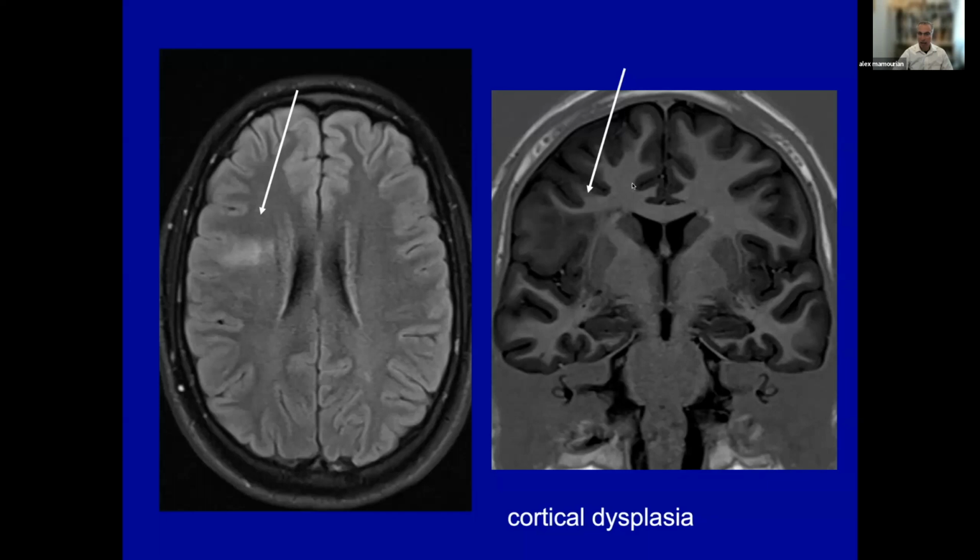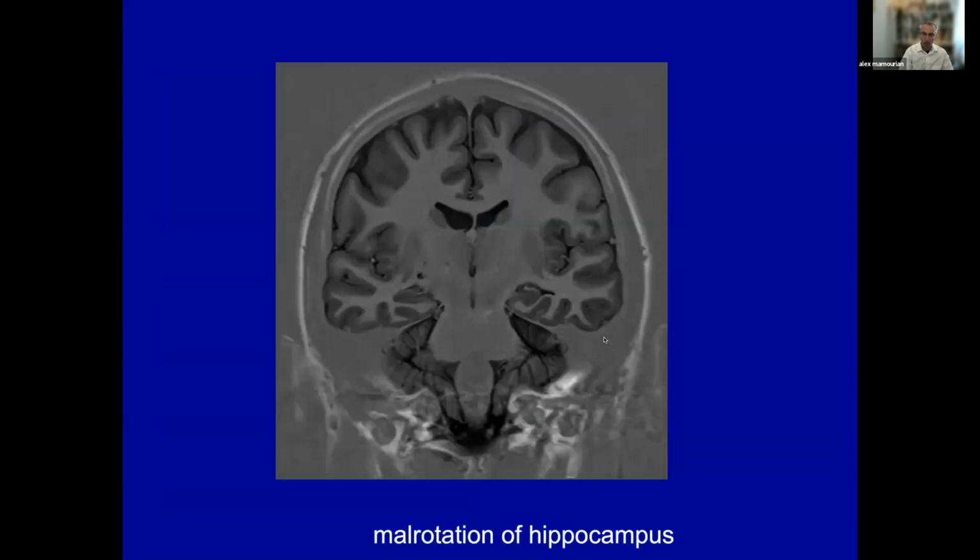This is going to allow you to identify areas of thickening in the cortex, areas of abnormal heterotopic gray matter. Here again, you see the normal temporal horn and the white matter that abuts the lateral border of the temporal horn, and the normal appearance of the hippocampus bilaterally with that wavy appearance of the anterior hippocampus. So this is a pulse sequence that you want to have as part of your workup of the patients with intractable epilepsy.